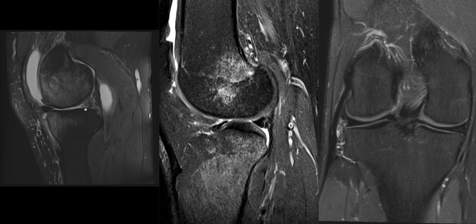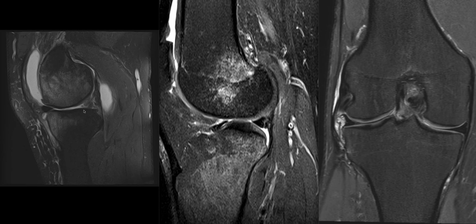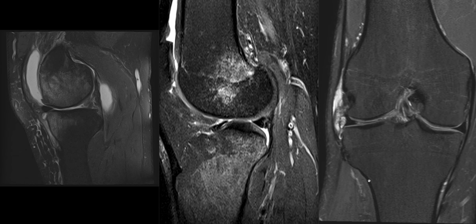Horizontal tears are commonly asymptomatic. Longitudinal tears are frequently associated with ACL rupture, occur in the red zone, and can thus heal. And radial tears, which we've seen in two types, in the central body and near the posterior root. These radial tears, particularly the ones in the central body, are not uncommonly associated with meniscal cysts, and we can see an example of that in this patient.